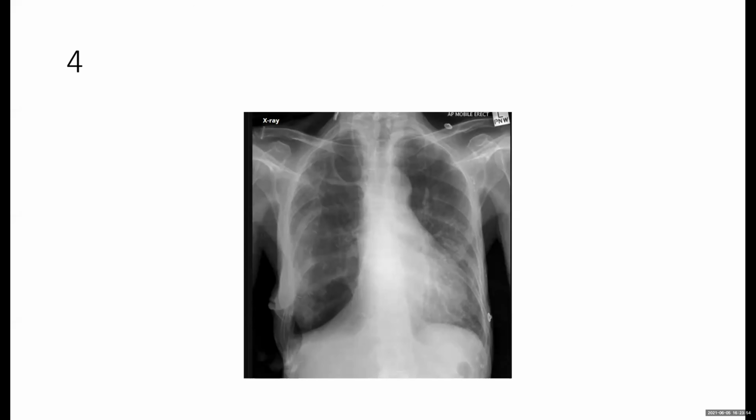This is an AP view of chest X-ray. I'd like to see, the mediastinum looks normal and the diaphragm is not remarkable. Because it is an MSK session, I'm starting with the thoracic cage first, looking to the clavicles. Actually, I put this film by mistake. Initially, I thought this is an MSK film, but later it's not purely MSK.